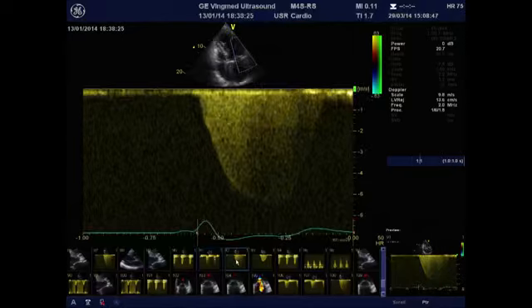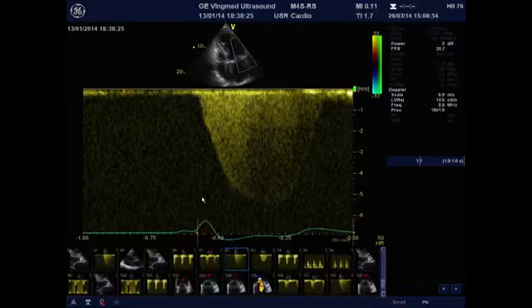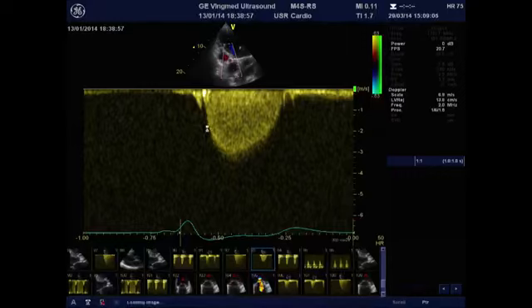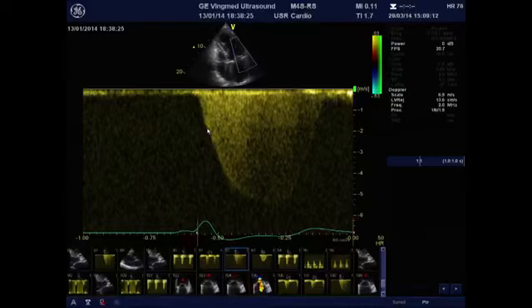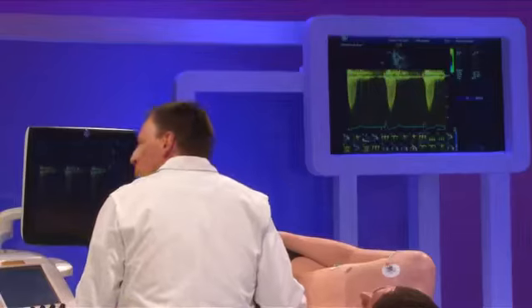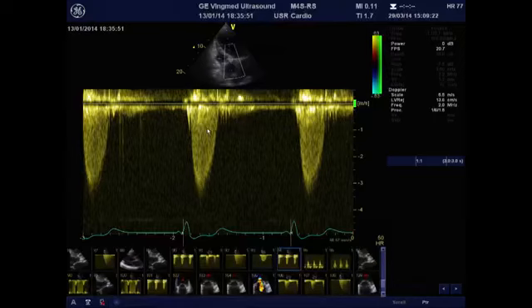If we go back first on the mitral flow, we can see that the start of the flow is within the QRS, whereas for the aortic flow, it starts after the QRS. It's clearly later than the previous flow. And obviously, a major difference will be that the mitral flow has inherently a greater maximal velocity than the aortic flow.